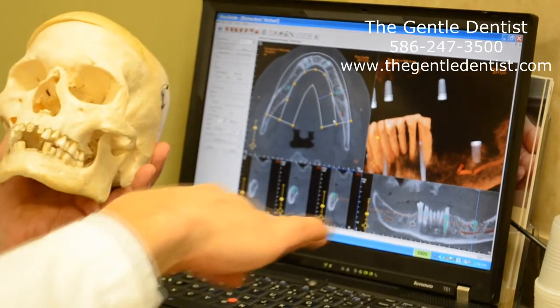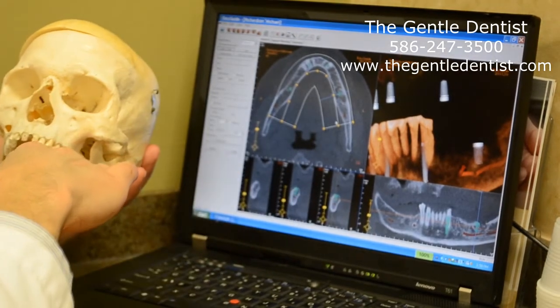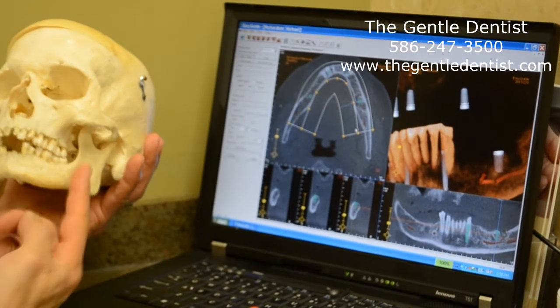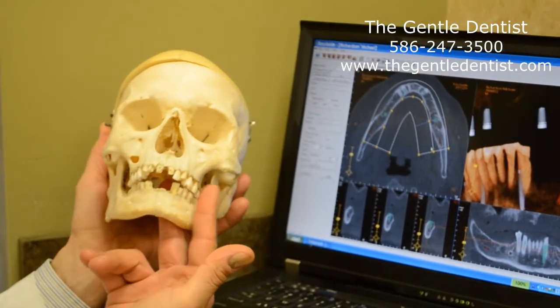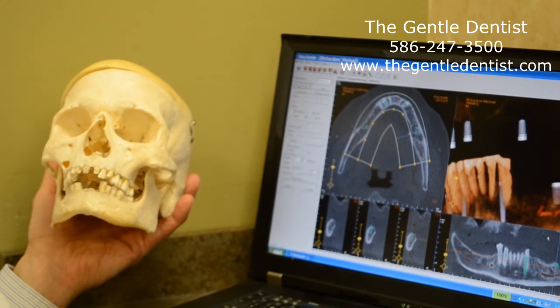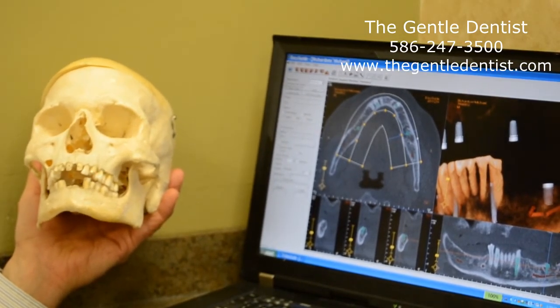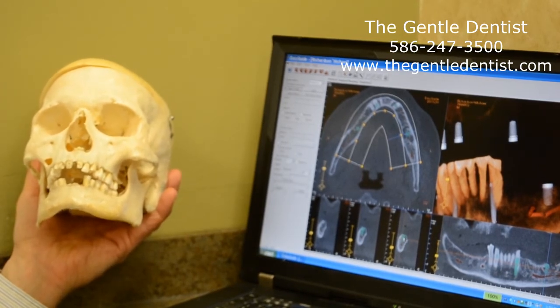Now, how this is generated is through 3 different axes. One axis actually is an axis that cuts off like this. The other axis gives us this section here where we can look at the cross section. For example, let's say of this jaw right here, we can take it cross section like this shows, and this shows right where this tooth is here, where you see these little cross hatches here and here, and that shows right where this implant is.